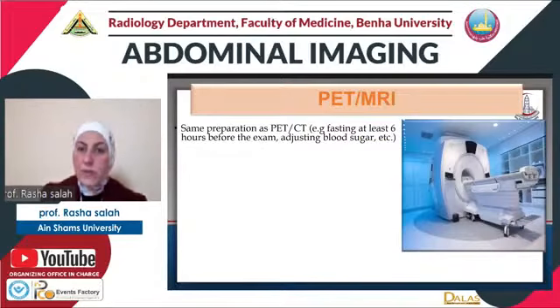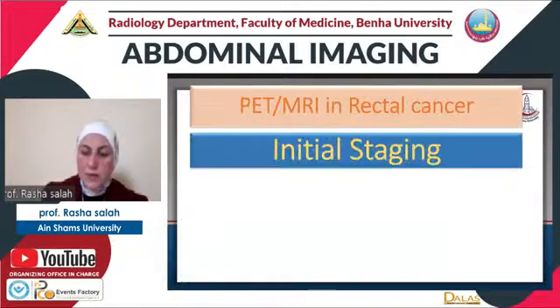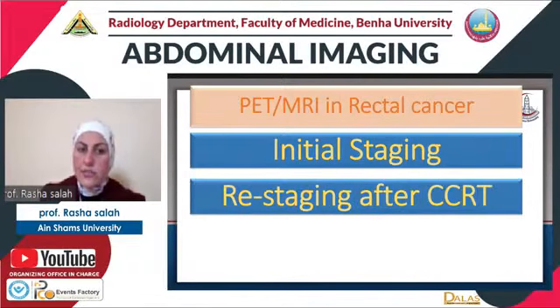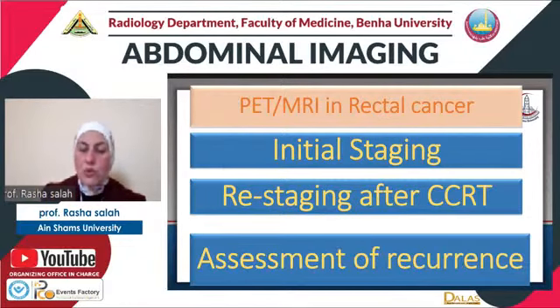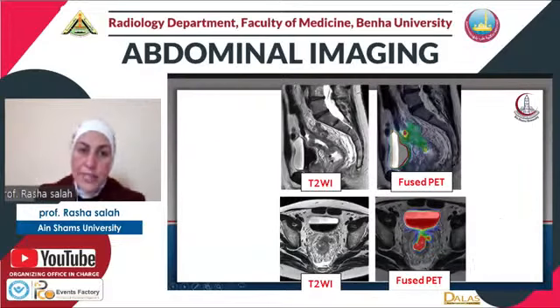The preparation for the PET MRI, as for the PET CT, needs some fasting, and we perform the dedicated assessment for the rectal and the whole body assessment in initial staging and restaging, and also in assessment of recurrence. This is an example for a patient in initial staging by PET MRI.